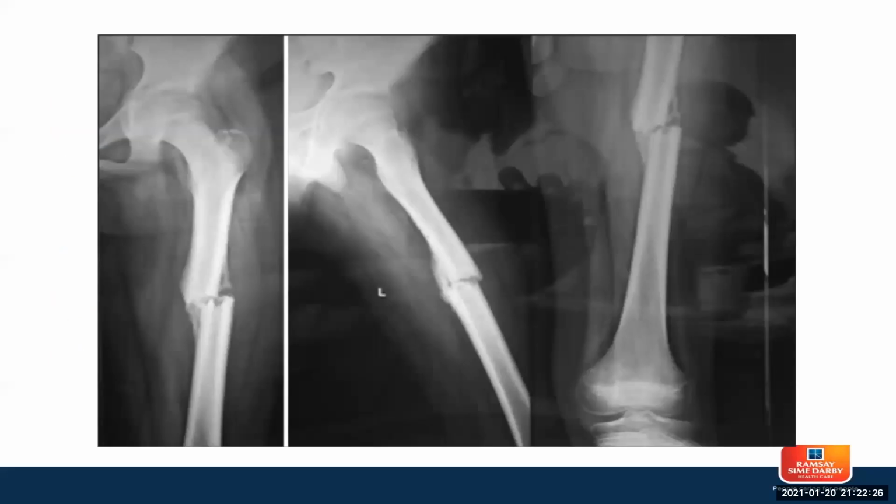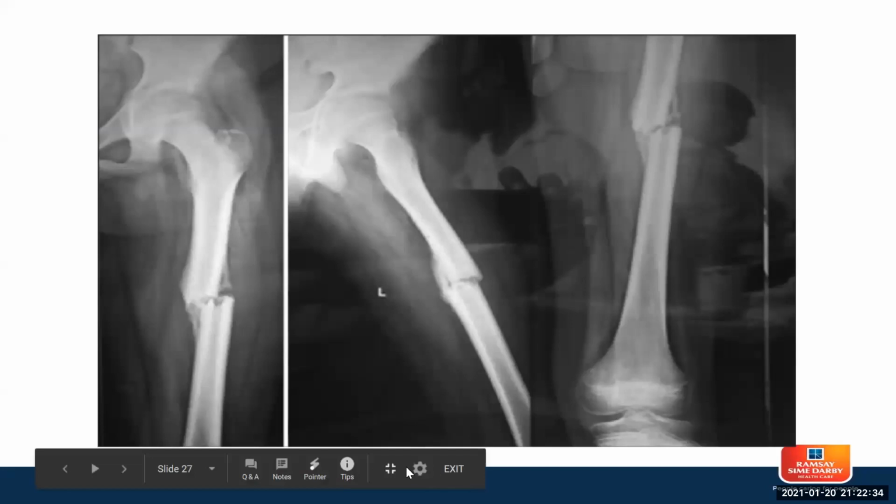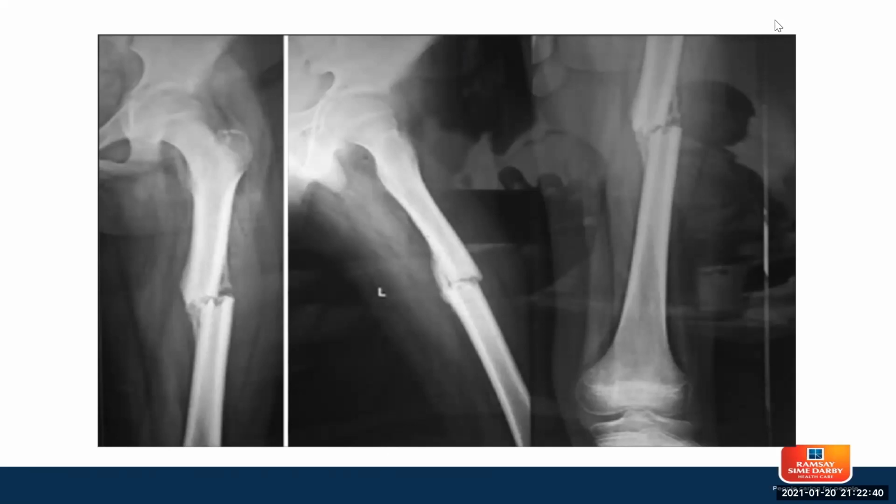So I'll go through them myself here. Maybe I'll ask you. Can you describe the fracture, please? Let's see. Anyone? I'll give you 2 minutes. Come on, guys.